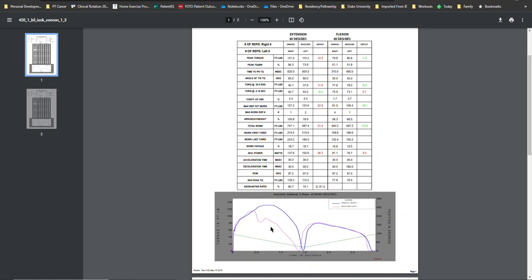And why is this the case? It's because he has this pathological curve where he has a dip and then he falls off. As he nears mid-terminal knee extension, his force production drops. Now, you have to inquire a little bit more when you see such results, right? You have to ask the individual if they're having pain, and if so, that may explain the inhibition. At times, these curves have been diagnostic, though their sensitivity and specificity has been called into question in regards to diagnosing ACL deficits and or meniscus injuries.